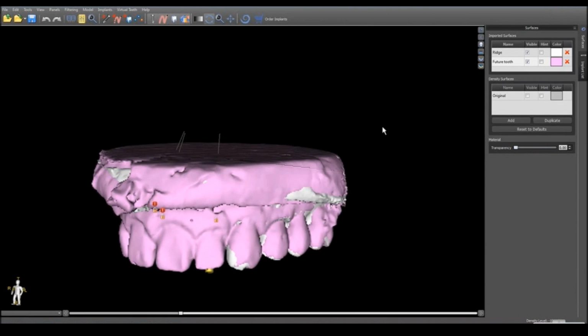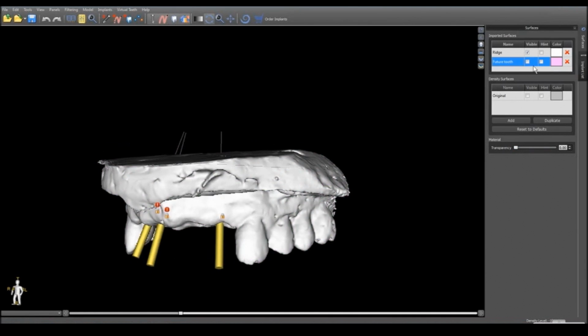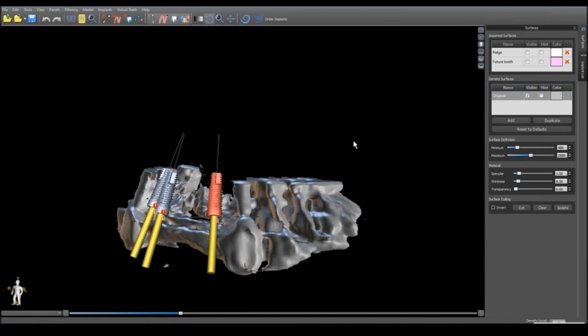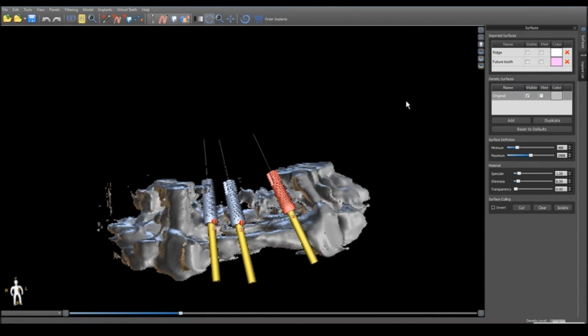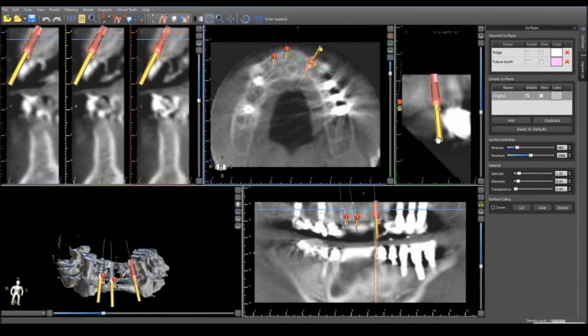You can put the flipper back and see where you are. And also by adjusting the density threshold, you can get a sense of the relationship between the root and this implant, and the number 7 implant and this cuspid. So that's using a flipper for future tooth position.